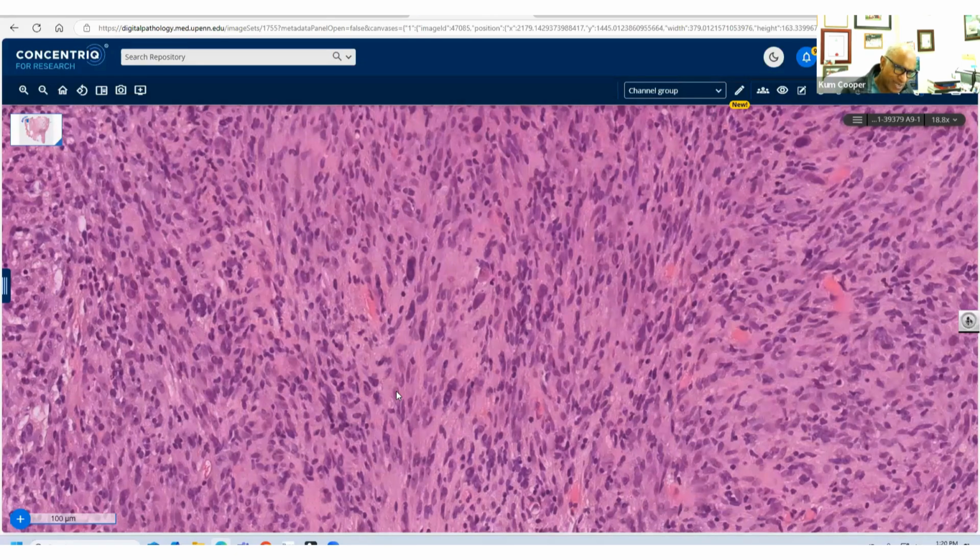There's another route as well with these more epithelioid cells, plump epithelioid pink cells, INI1, SMARCB1 deficient. This was lost for SMARCB1. So we were able to call it an epithelioid MPNST, which does not go via the PRC route. So H3 is not helpful. H3 was intact in this.